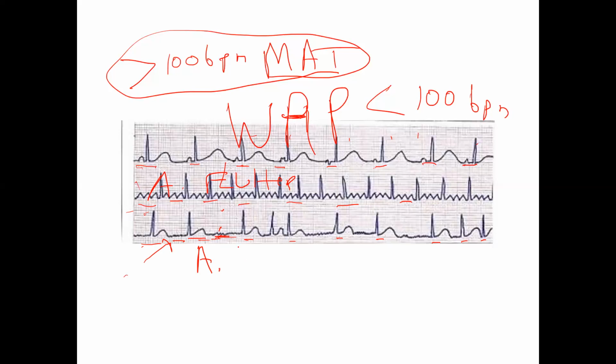So what do we call this one? Is this supposed to be AFib? This is AFib, yeah. Look at the line. Sometimes it kind of goes off baseline, but this is not a straight line, because if you see this, that's ventricular, or possibly, if this is normal, that would be junctional. So this one has normal QRSs and has the P wave.